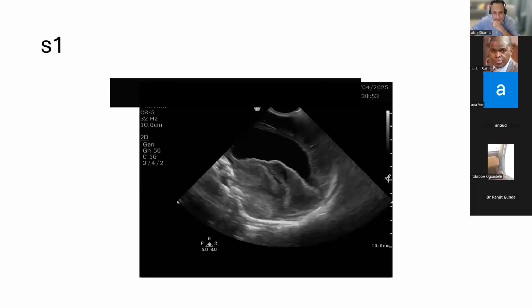Actually, I forgot to write if it's right or left. No problems. My gut feeling is this is somewhere between the midline and the right because you've got clot, but you can see corpus callosum at the top there. So it's kind of somewhere in between.